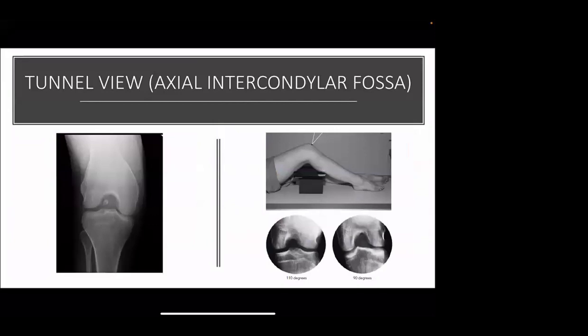Tunnel view, axial intercondylar fossa, used for assessment of a loose body and better delineation of the intercondylar eminence.